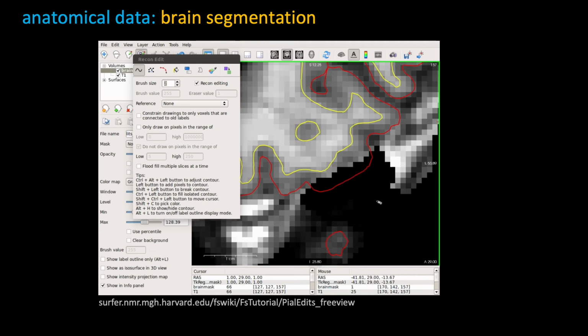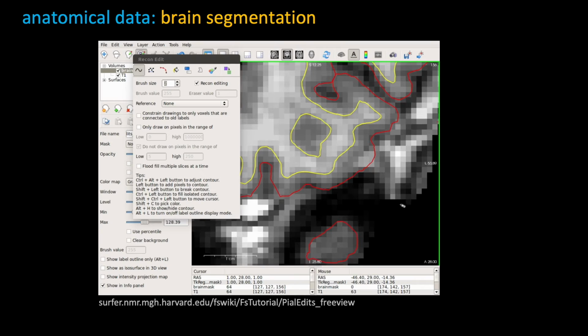My recommendation would be, whenever you're doing it, to at least have a view open, or at least check it in all 3 different planes. So you can either do it sort of as you go, or you can look later in 3 different planes to make sure that it doesn't look too much like a salt pattern. But this is basically a practical demonstration of how you can do this.